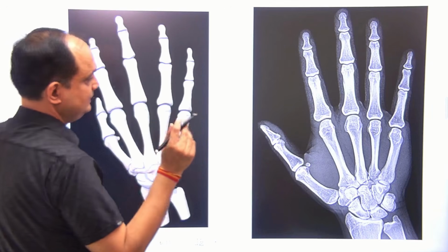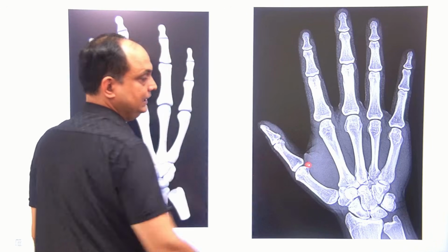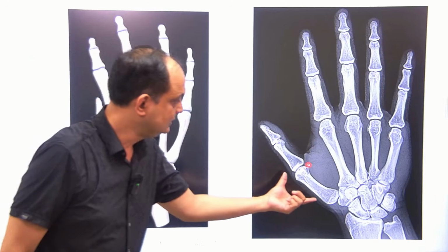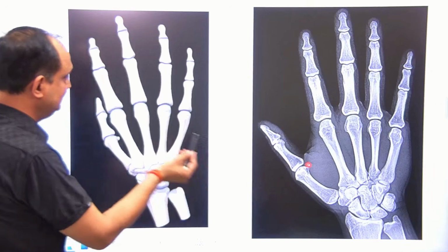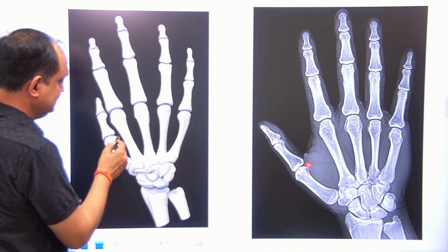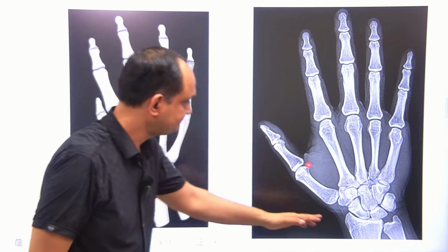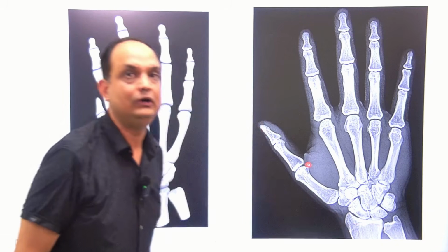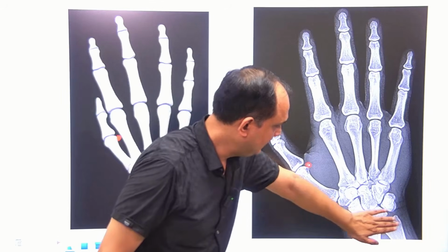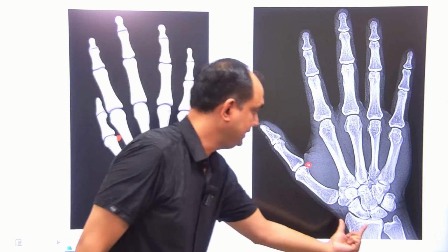Now, why I am saying this? Because you can see that this sesamoid bone is visible on the anterior aspect of this first metacarpal. Clear? Now, this is the same picture here. You can see that this is the sesamoid bone is visible here. Now, apart from that, the lower end of these forearm bone will also give the idea that this is not the anterior surface, this is the posterior surface of the lower end of radius.